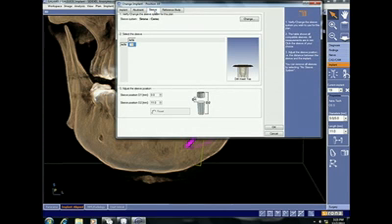Okay? Now, this is one of the trickiest things when you're working with CEREC Guide. Traditionally, everything that I'm showing you here is managed by CCAT, especially if you were to use the Classic Guide and the Opti Guide. The benefit is that it's quite honestly a nice system of checks and balances. They have the ability to design the location of this master sleeve within the surgical guide. And it's CCAT who's responsible for setting these distances that allow us to understand the drilling protocol as specified by the implant system that we've selected. What I'm actually going to do is do all of that myself, because with CEREC Guide, I'm ultimately responsible for designing the guide from start to finish.